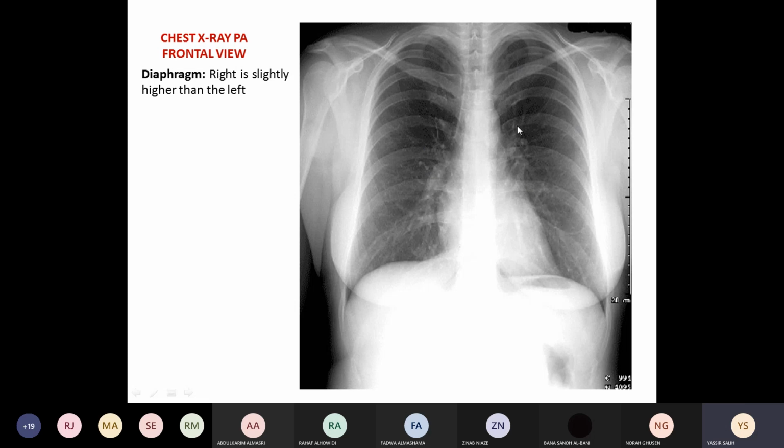These branching lines taper: they are many in the center, and they taper on the periphery. Notice they decrease as we move toward the periphery. This is a blood vessel. But this is the right hemidiaphragm, which should be seen clearly except in the area in contact with the heart and mediastinum.